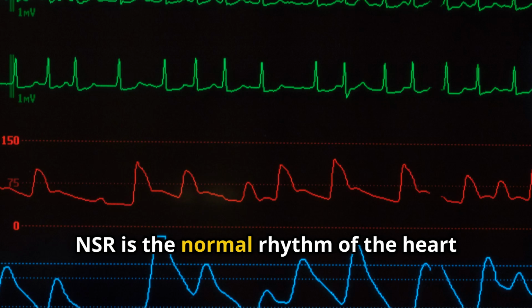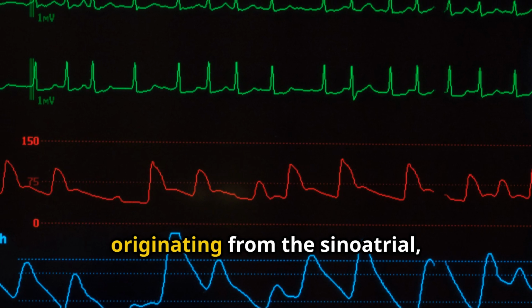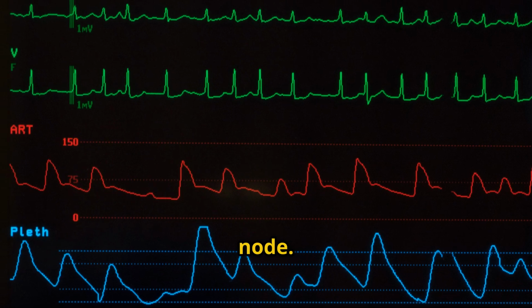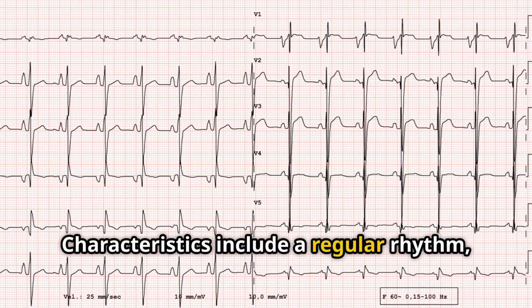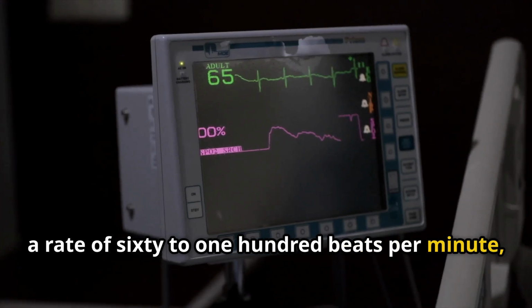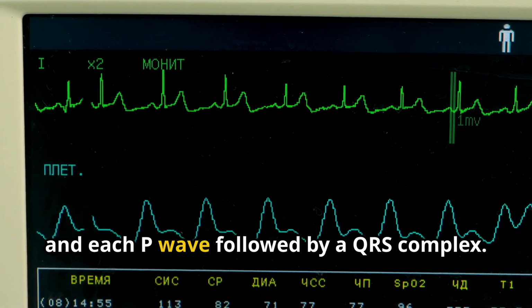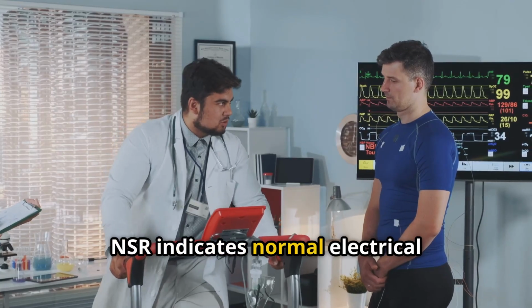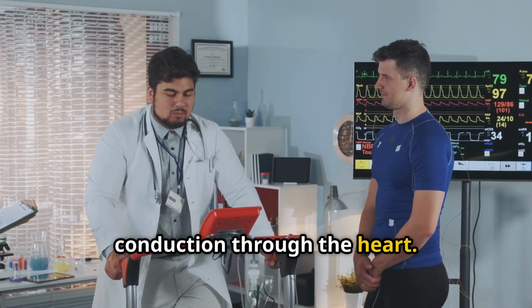NSR is the normal rhythm of the heart originating from the sinoatrial or SA node. Characteristics include a regular rhythm, a rate of 60 to 100 beats per minute, and each P wave followed by a QRS complex. NSR indicates normal electrical conduction through the heart.